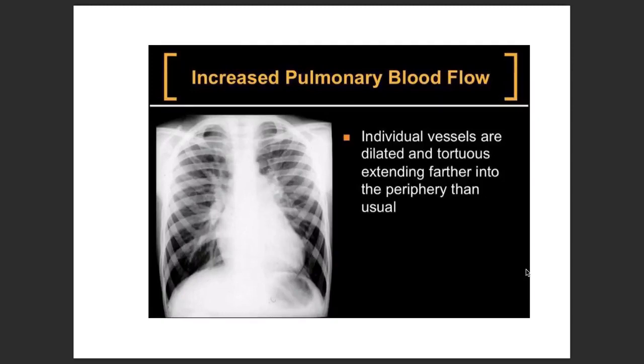So what is happening over here? What is happening in this field? As you can already see, the individual vessels are dilated and also tortuous, extending into the periphery.